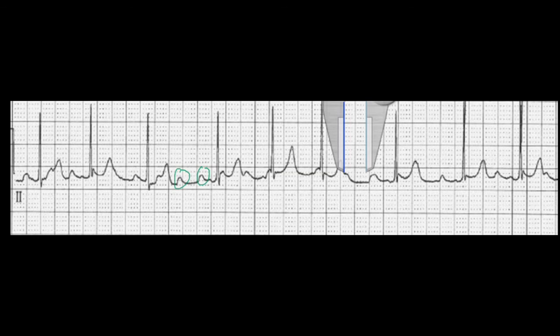And here's where I start to run into a little bit of a problem, because there's a P wave in a QRS. I can see those. But as soon as I start getting down to some different things, if I brought this back down here, that's a P wave that sits right there.